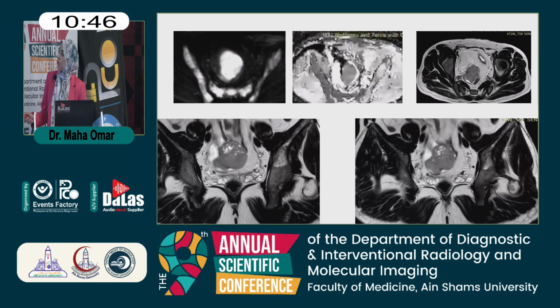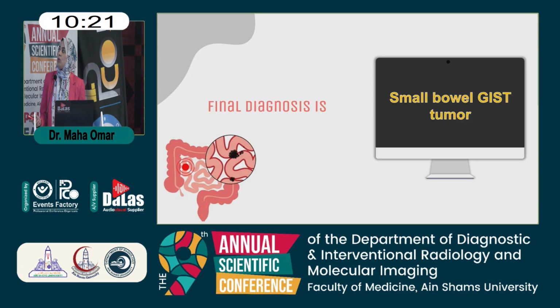This lesion is well-defined, has well-defined edges and areas of cystic degeneration. It has more or less homogeneous post-contrast enhancement apart from the small cystic areas. The patient underwent surgical excision of the lesion, and the histopathology was small bowel GIST tumor.